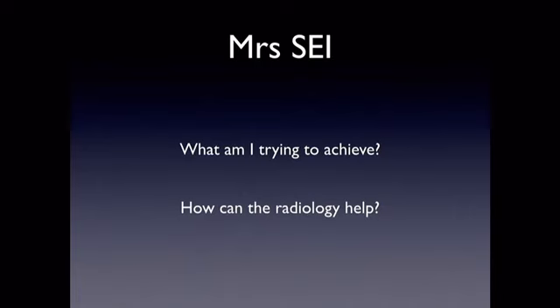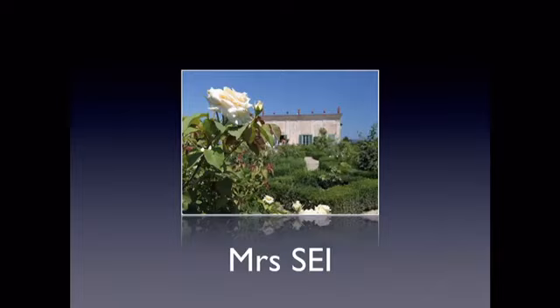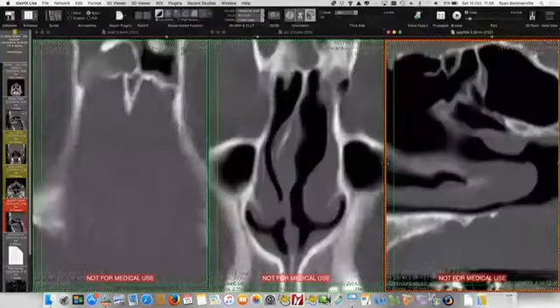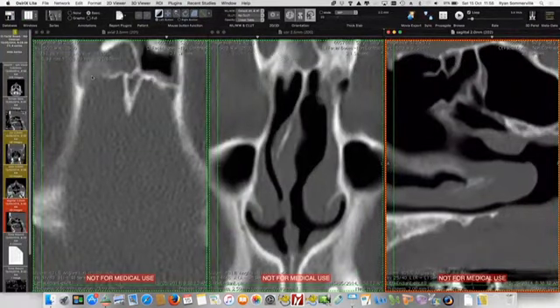And with this patient, I'm trying to resolve her pain, of course. Everything else had been done before, and so who am I to say that I can do the job better than the other guys? But what I'm really looking for, oh, this is all completely wrong.